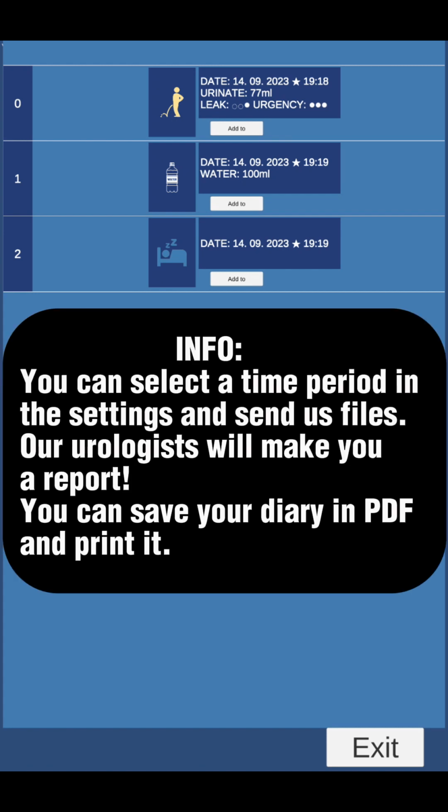Info. You can select a time period in the settings and send us files. Our urologist will make you a report. You can save your diary in PDF and print it.